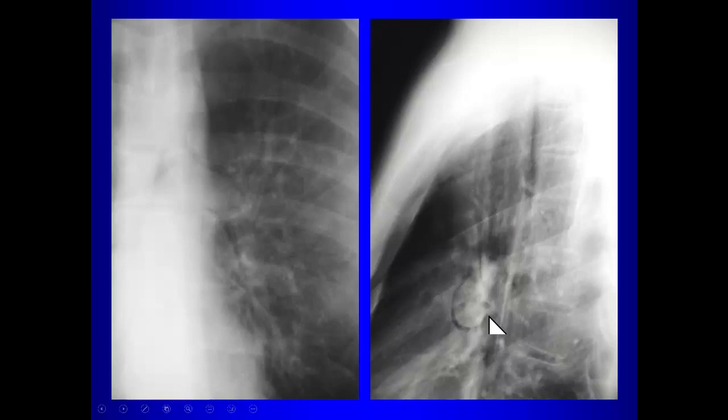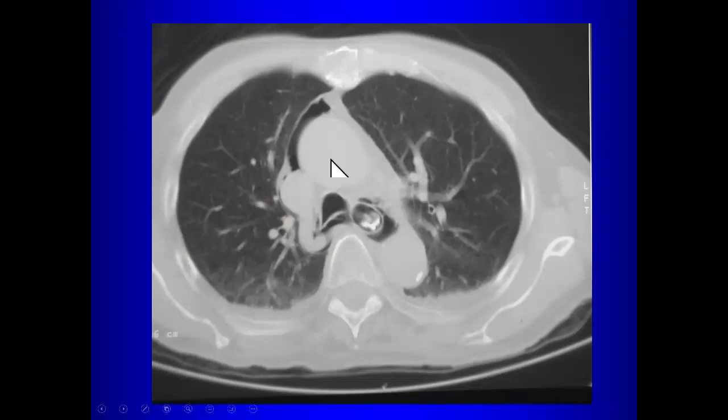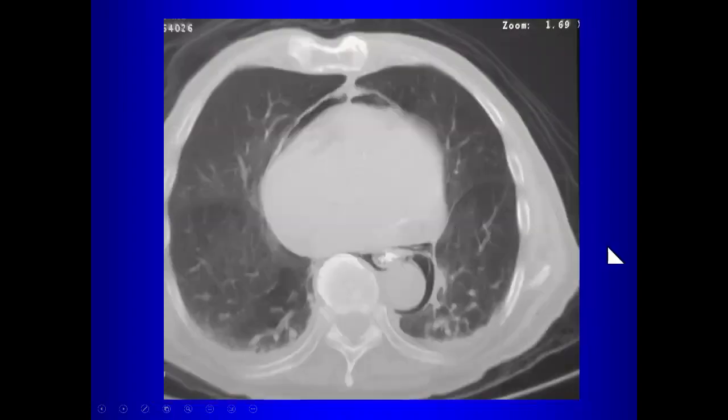Not COPD, no. Not emphysema, no. Asthma. So asthma, especially in children, can result in spontaneous pneumomediastinum. That was the case in this patient. Here's a patient who has pneumomediastinum. This was from perforation of the esophagus. Here, there's air in the mediastinum, also outlining the esophagus. And here again, same patient, we can see the air outlining there in the mediastinum.